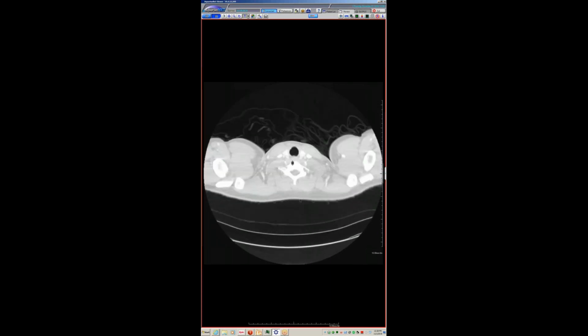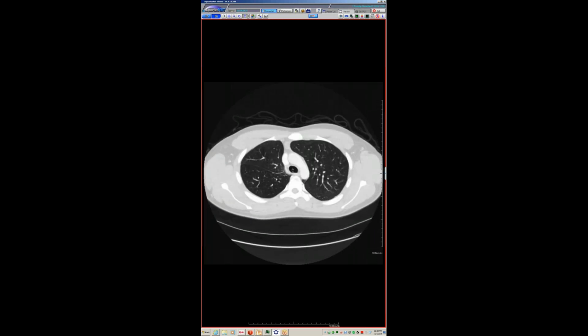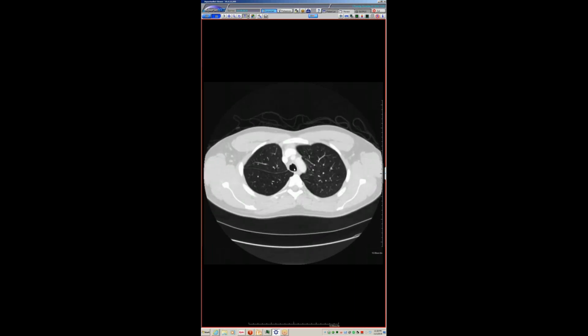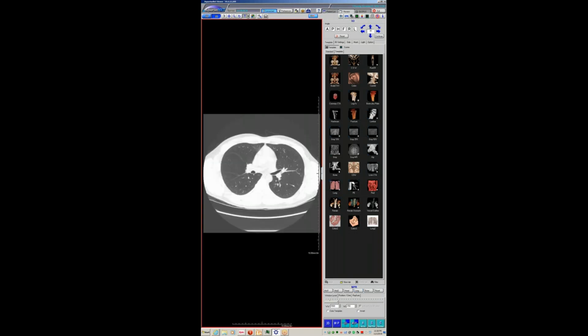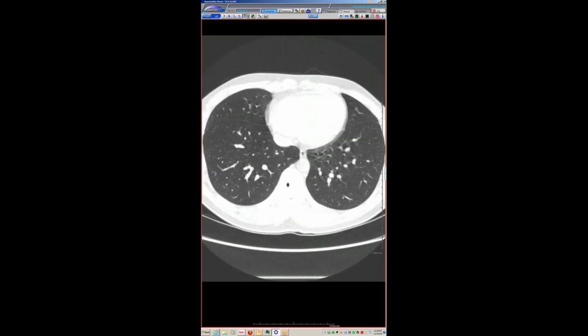So just a case of tracheobronchial papillomatosis with parenchymal extension, although it's kind of obvious. I don't see the parenchymal extension, but the squamous cell cancer proves that. And it could have been just a primary airway involvement of a squamous cell versus a truly parenchymal lesion that grew. I don't know if anyone has any thoughts about how many they've seen in the upper lobes versus the lower lobes.